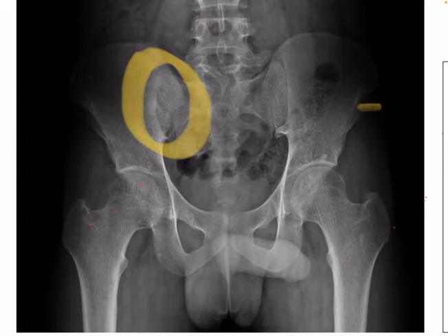It may be primary or secondary TB of the sacroiliac joint, right side. And what is the phase? Either acute or chronic, or early or late. So it is a late phase. So it is primary or secondary TB of the sacroiliac joint, right side, late phase. That should be your conclusion.